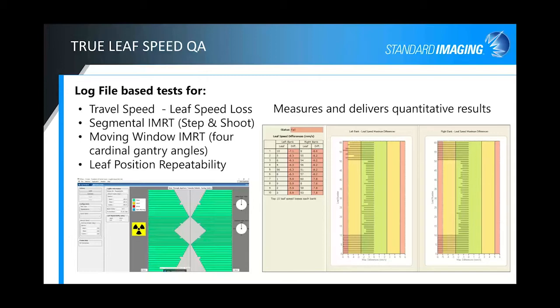And the nice thing about that is, as you can see here, here's a results page on the right, showing you the individual leaves and the results. You can see here the outer leaves tend to be more problematic just because they don't move as much. They may have some stickiness to them because of lubricant or just not being used. So those tend to be more problematic, and you get individual looks at those leaves as well. And you can see here the inner leaves, you get a much better agreement and passing where those leaves are used more normally and more frequently than your outer leaves.